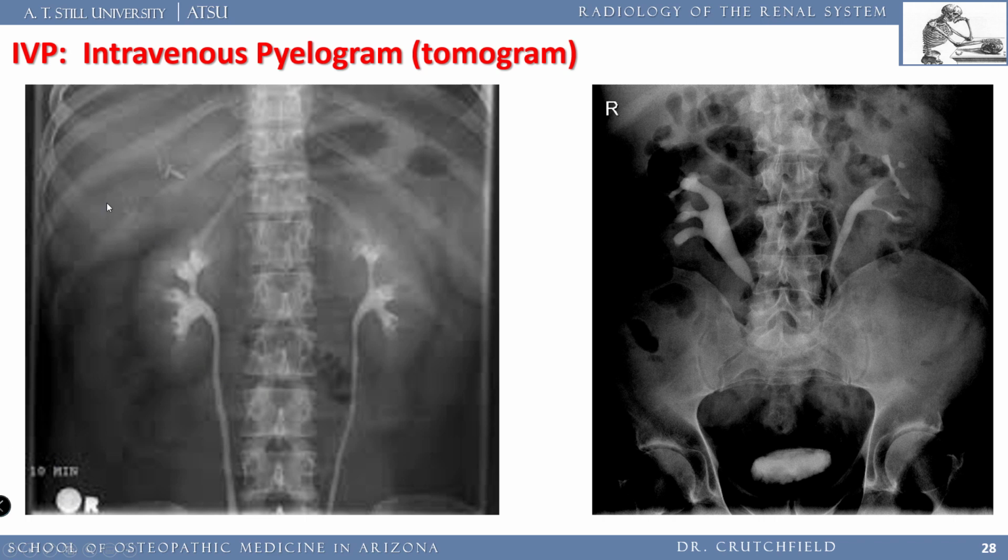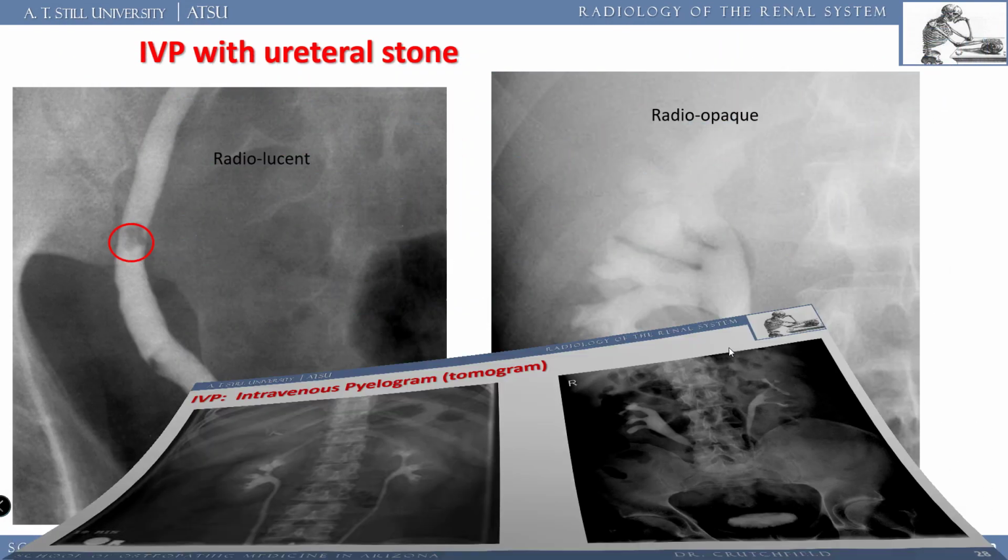So they spun that X-ray source over the patient, back and forth, X-ray, X-ray, X-ray, boom. And this is what we got at 10 minutes. This one could just be I just had a CT scan and you took an X-ray of my belly. I hope that makes sense.